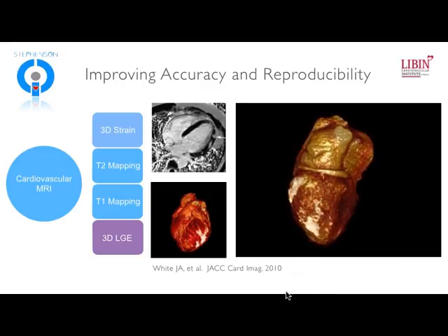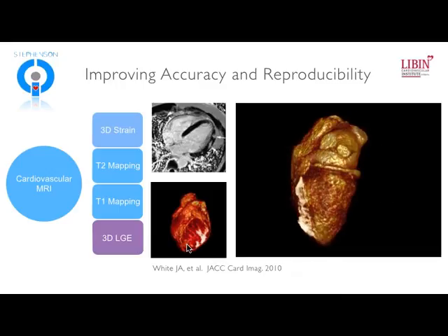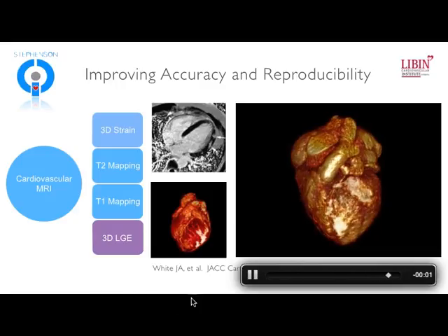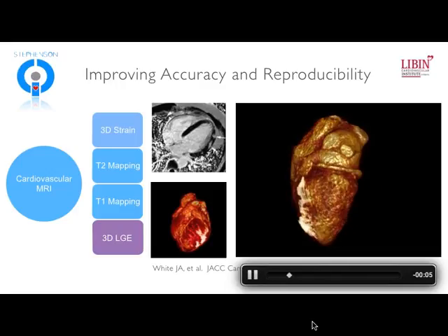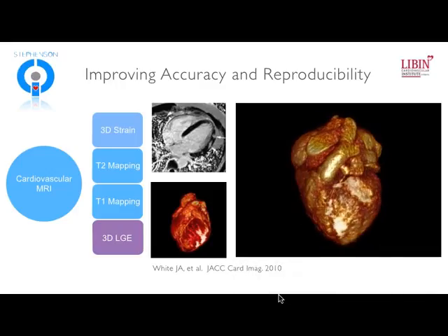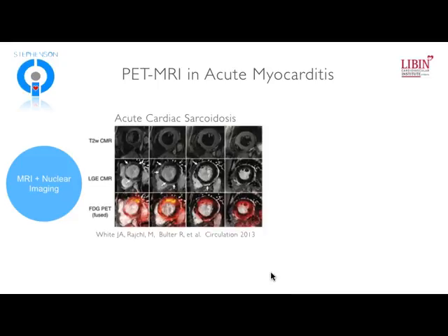And if you look at patients with viral myocarditis versus those with sarcoid and other inflammatory myopathies, you actually do appreciate that there are emerging patterns, and typical ones as shown here. But this is a person that had a very clear viral myocarditis, whereas this is a person with sarcoidosis, and you can see that there are very characteristic distributions that occur.